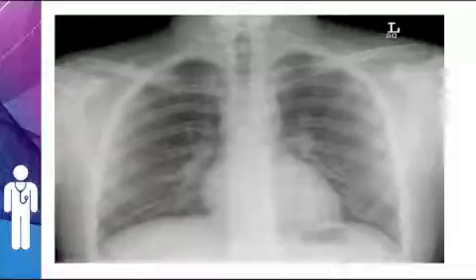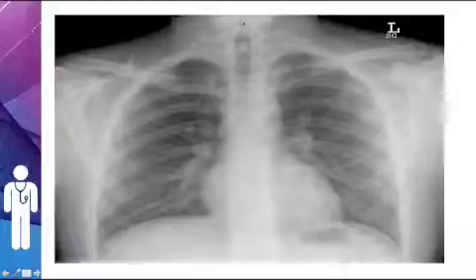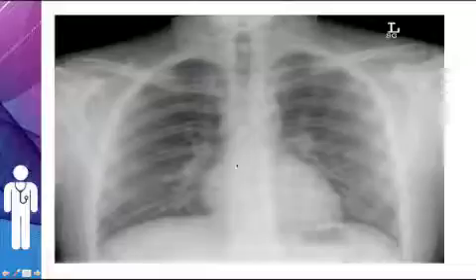So we're trying to work through that doctor's ABCD approach. So demographics, we know it's an old man from a nursing home, doesn't look particularly rotated, it's good penetration. The apparatus, well, there's no central line, he's not intubated. There does appear to be a possible foreign body here. The trachea is in the midline, and the carina is here. The hila look normal.